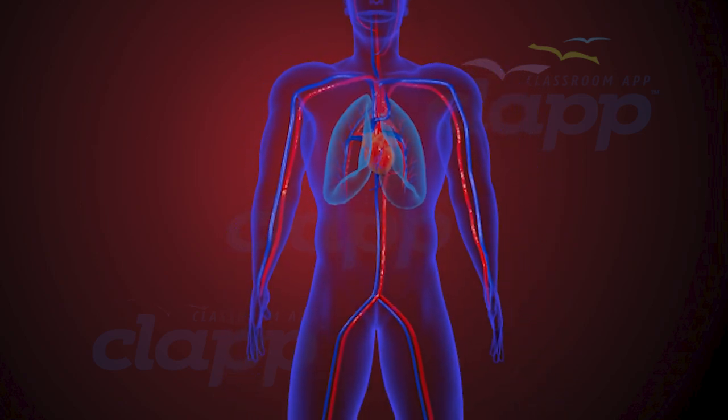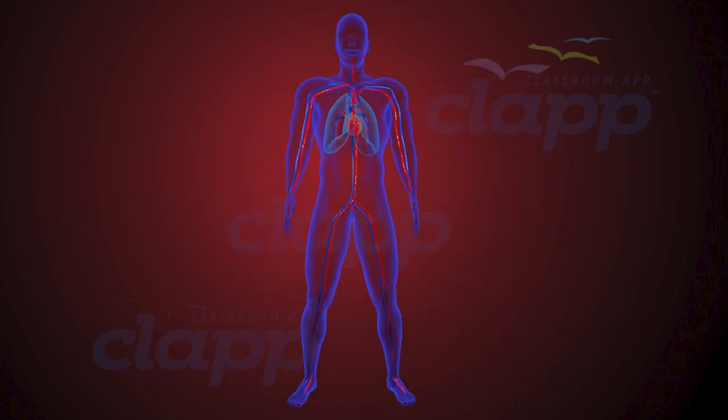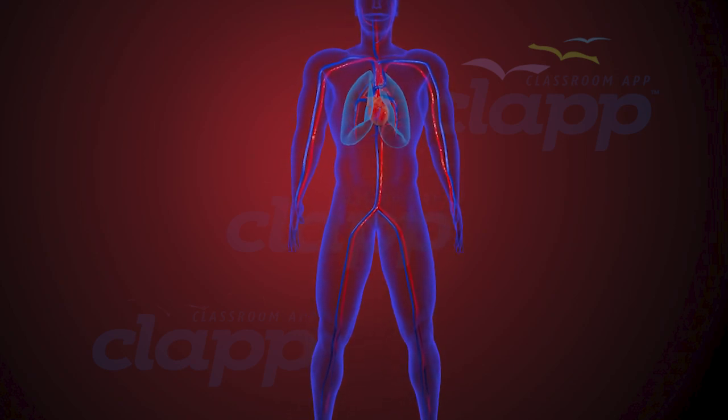This decision is based on factors such as the location of the blockage, accessibility, and the overall condition of the patient's arteries. Most commonly used entry points are the radial artery and the femoral artery. The radial artery approach is also called the radial approach.